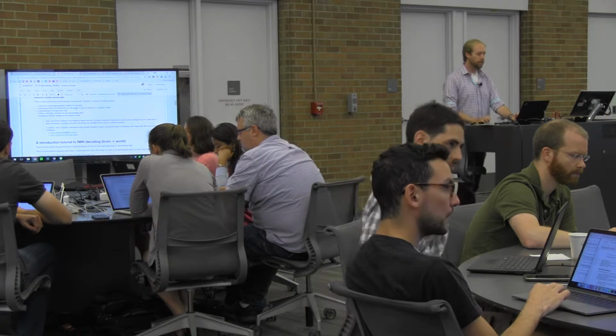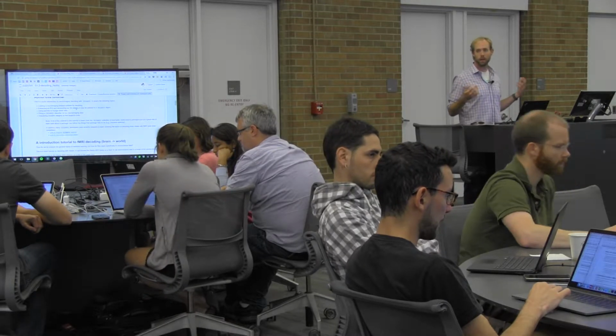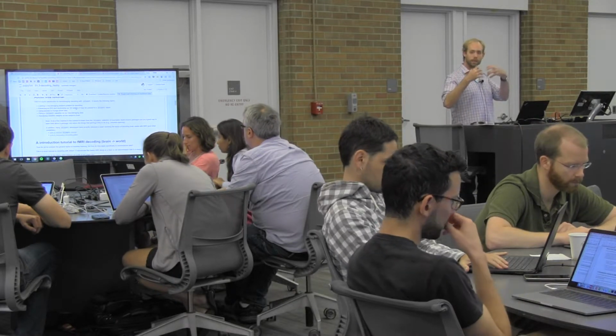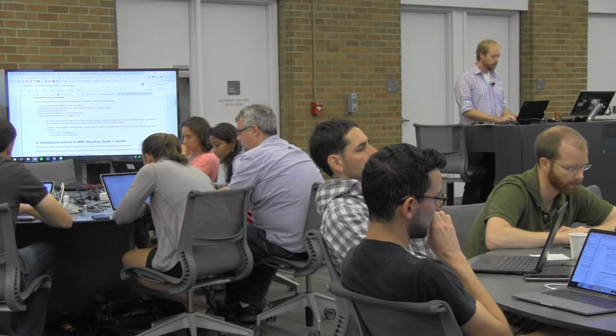Okay, so as I mentioned before, this is a data set that the Haxby group has made available to the public, and the developers for nilearn went online and figured out a way to manipulate it and get it into a form that you can download as a nilearn data set.